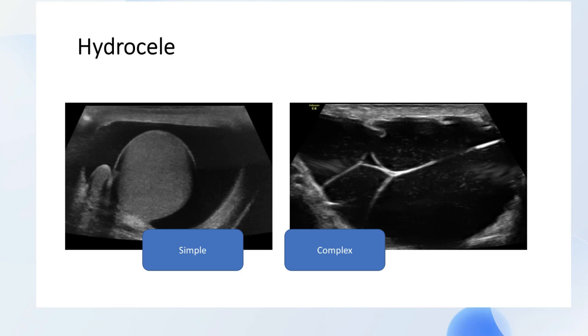So let's now go into the pathologies which affect the scrotum. When you're dealing with these pathologies, I need you to know the distinction between anatomy that you know and sonographic anatomy. So if you relate things from the perspective of sonographic anatomy, your life becomes very easy.